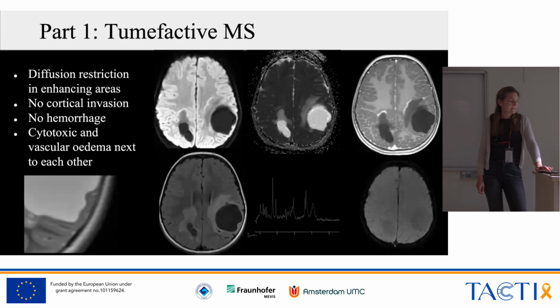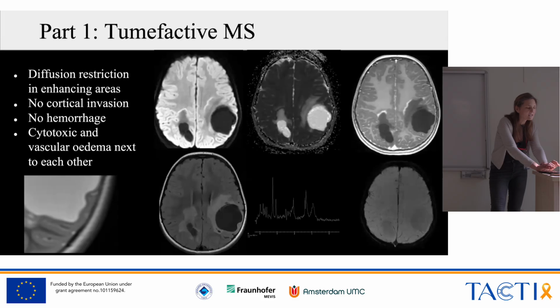This is a summary, and as you can see here, very important, that's why classic T2 weighted images are also important, because you can see here that the cortex was not invaded by this lesion. This is very important as a differential because, of course, could it also be a tumor? Well, bilateral tumors actually do exist, also in gliomas, which would be a malignant primary brain tumor. But for the age group, that would be very unusual.